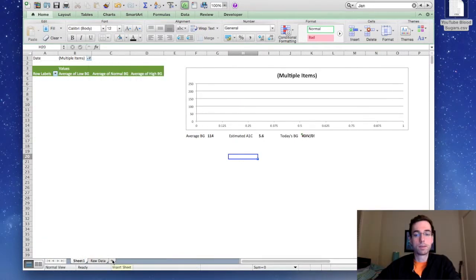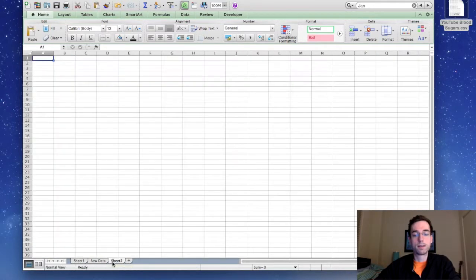Alright, and last but not least, I'll show you how I make the table to see, if you want to track maybe on the days that you run, how does your blood sugar change, or on the days that you have a certain breakfast, let's say, what is your average blood sugar on those days versus others.